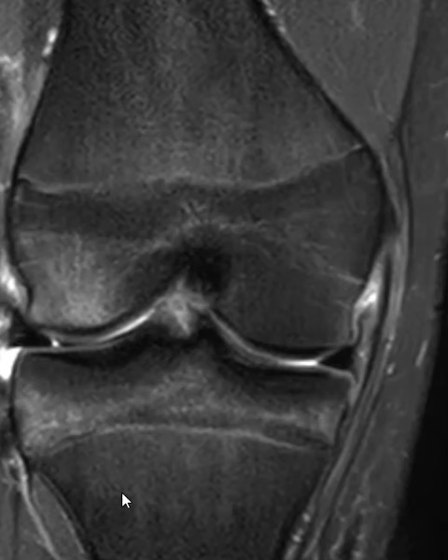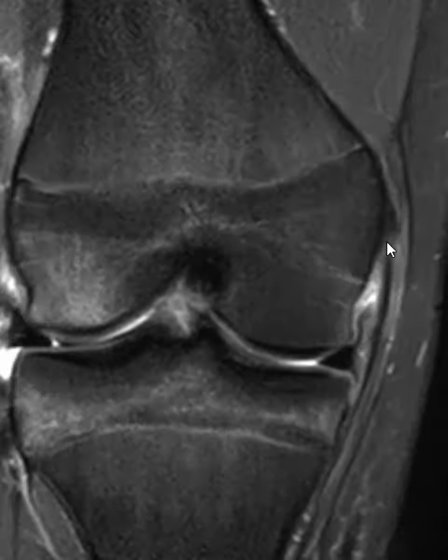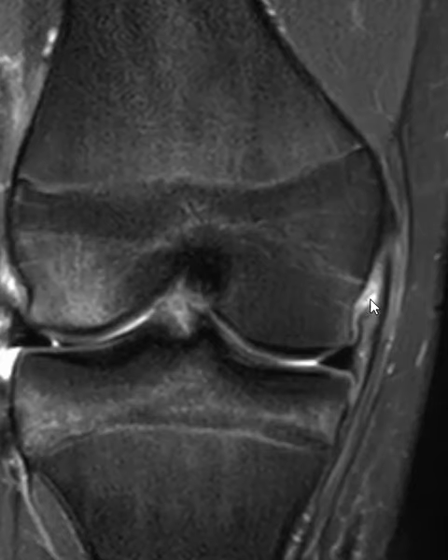So the medial collateral ligament, or the MCL, has outer thick fibers, here they are right here, coming off the femur down to the tibia. And again, these are the outer fibers, very thick, and then there are inner capsular fibers that are part of the joint capsule, and those are adherent to the meniscus body. And usually the outer fibers and the inner fibers are just glued together, and also the medial meniscus body is glued. So usually they're a continuous band of the MCL and the meniscus.